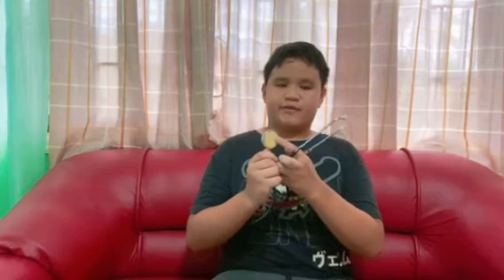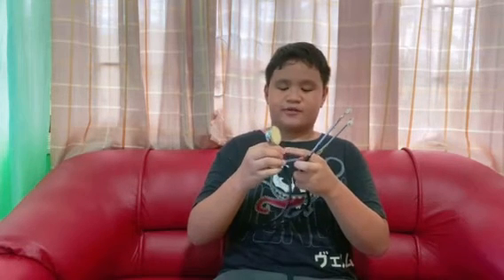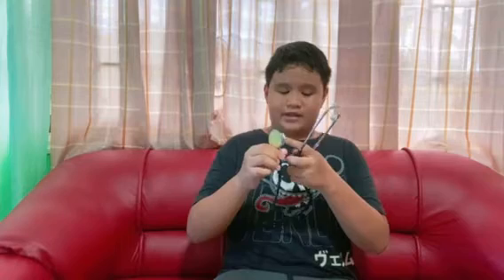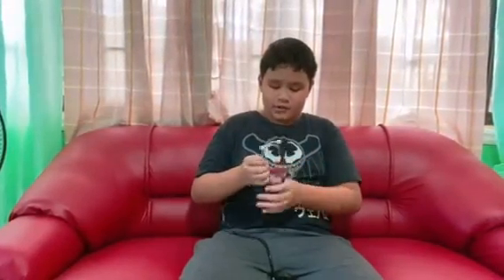First, the diaphragm, for high and medium-pitched sounds. The bell, for low-pitched sounds. The tube, where sound will travel from the diaphragm or bell to the earpiece, where you will hear the sounds. Earpieces must be angled properly so you can hear properly and be comfortable.